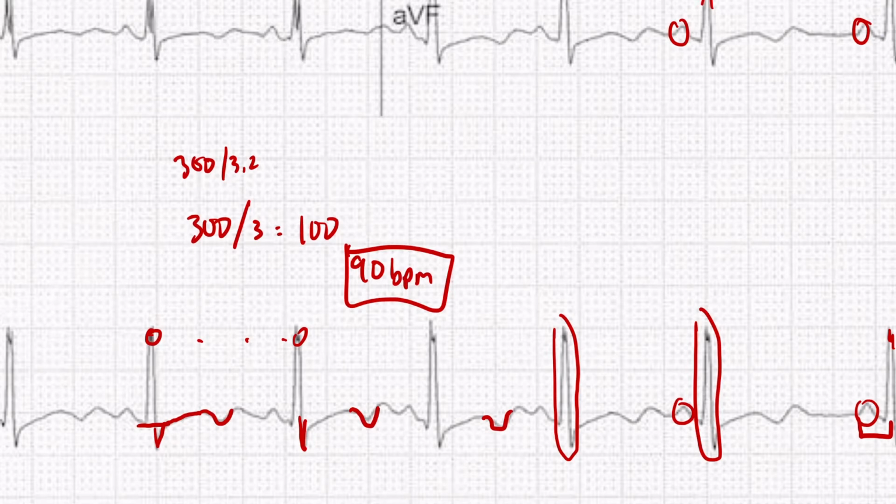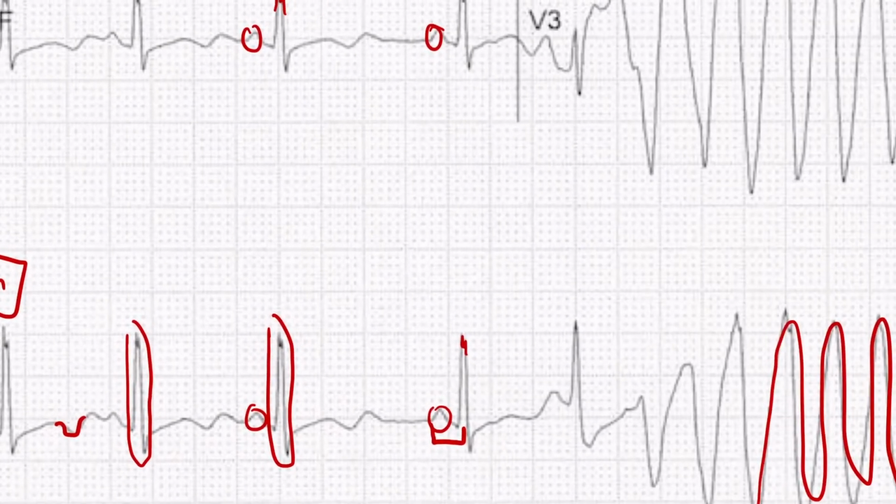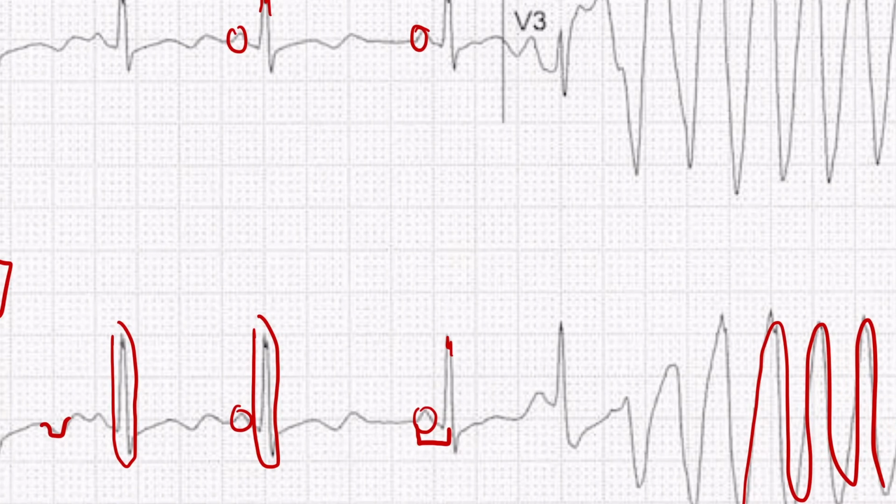And then finally, the QT segment. So we don't often look at this in many videos, but for here it is particularly important. So we will take a look. So especially in this section here, we can see from this R to R, it's pretty short. From here, we'll just go from this QRS complex to this QRS complex. It's a bit longer.